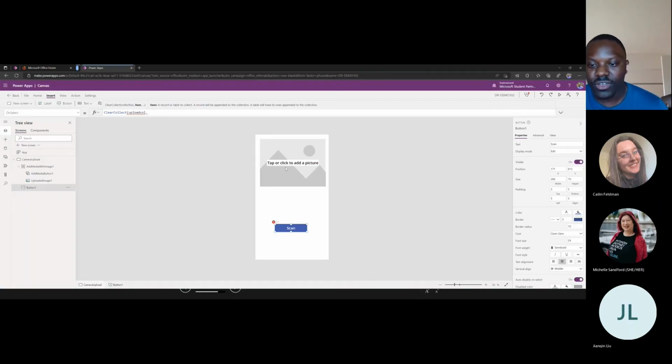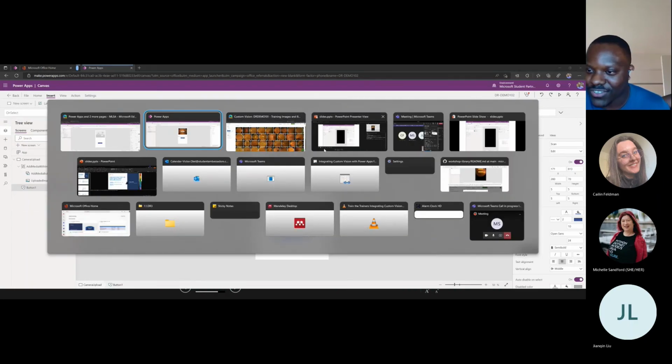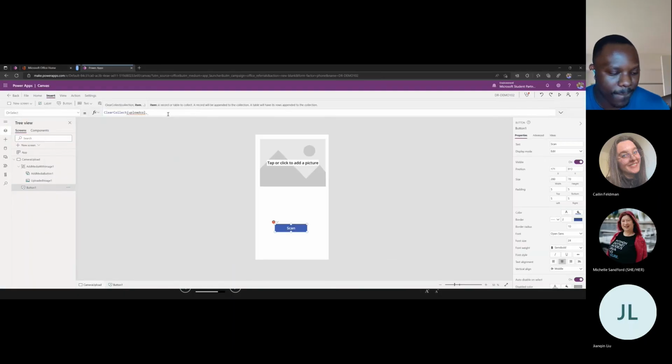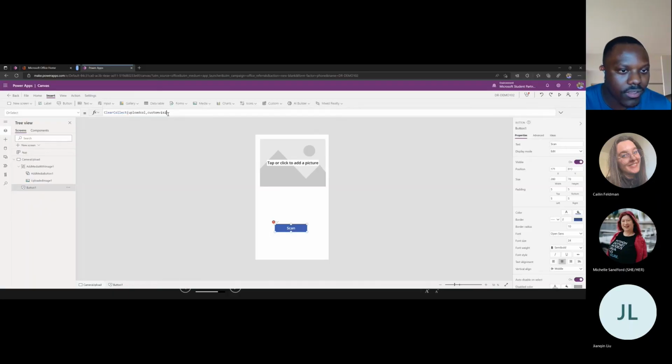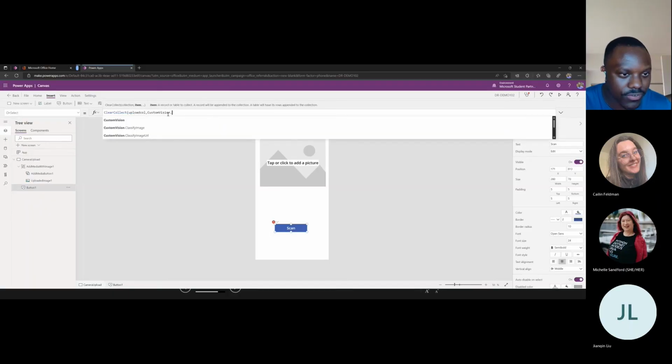And so at this point, we need to actually call the custom vision service. And so to do that, I don't think I'll remember it off the top of my head. So I'll show it to you. Can I remember it? Custom vision dot classify.